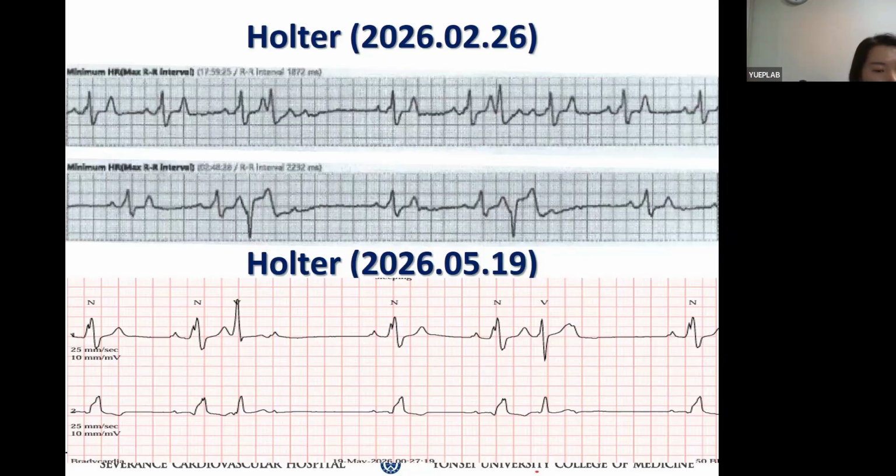The bottom one. Yes, the coupling is different. That can explain your alternation, right? Or not? Do you still believe there's another focus? So, two different possibilities here, as you said, but what favors which one?